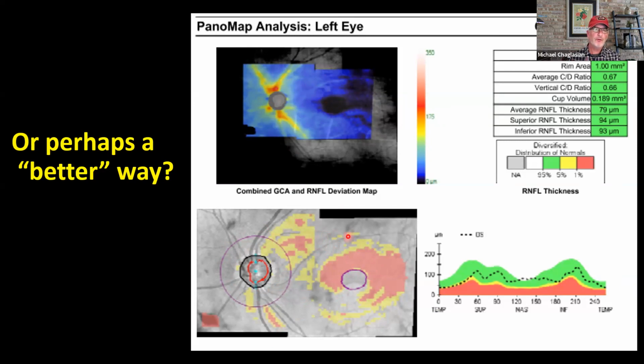So we take first one scan of the optic nerve head, we reposition the patient, change fixation, and scan the macular region. The device then stitches it together, and we're able to look at both at once, which to me is more efficient and saves me time. And when I see things agreeing on the same side of a horizontal midline, because glaucoma generally affects, at least in early disease, one pole over the other, meaning superior or inferior, it generally happens asymmetrically within the optic disc, and those things are agreeing with one another.